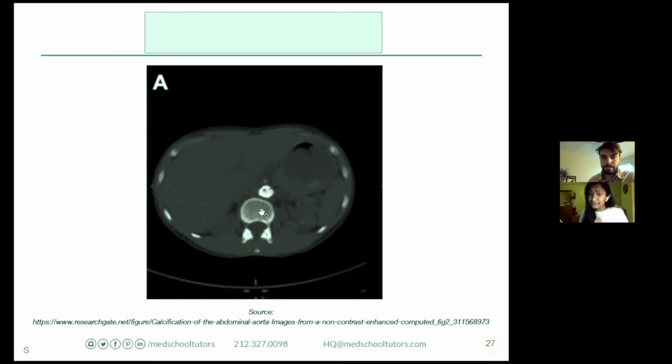If we had any sort of bony lytic, blastic, or lytic-blastic lesions, they are much easier to see on these windows, where you see this wider range in the bone and very limited visibility of the others. These are just tricks that we use in radiology to better see certain areas, because the human eye cannot see the same number of levels that the computer can.